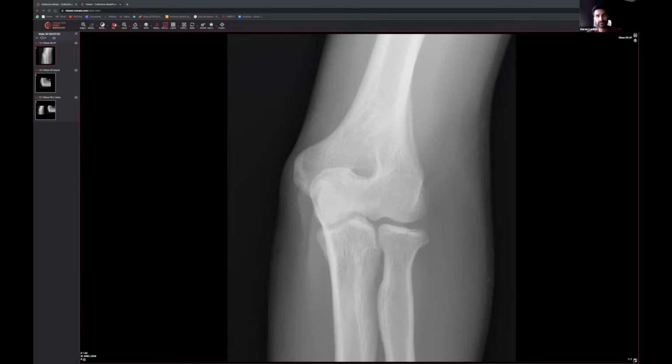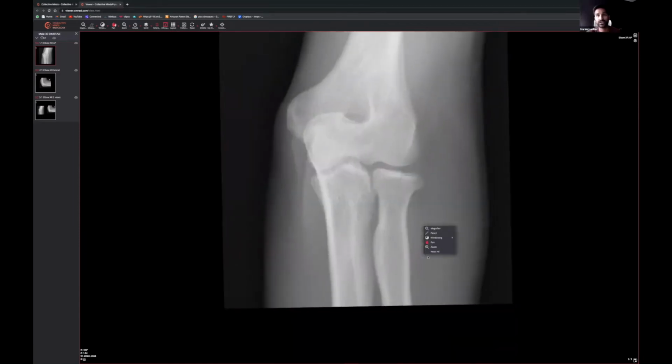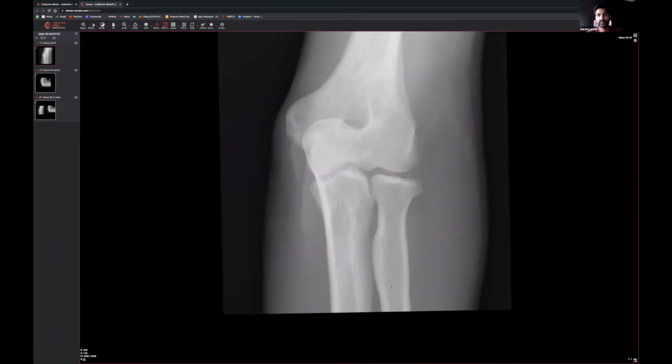Now, the reason I think that the radial head gets affected more than anywhere else in adult patients is that when the patient falls over, you get the forces going straight through the radius. At the wrist end, the largest part is going to be the radius, so that absorbs a lot of the weight, and it's translated all the way through to the elbow, where the bone becomes thinner and thinner. Then all that brute force gets hit right on the end like a hammer, hits the capitellum, and you get what is known as a fracture of the radial neck or the radial head.